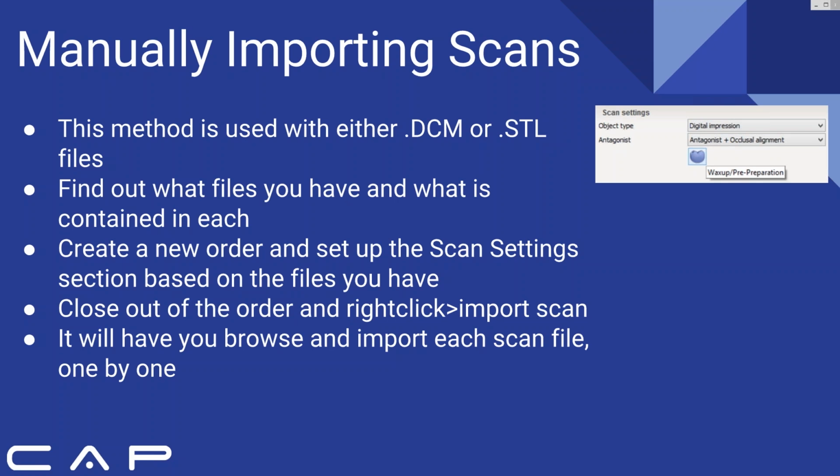And then the last method is the manual import method. This is how you go about importing STL files. And you can also import DCM, which typically is a 3Shape-specific format for standard scan files.